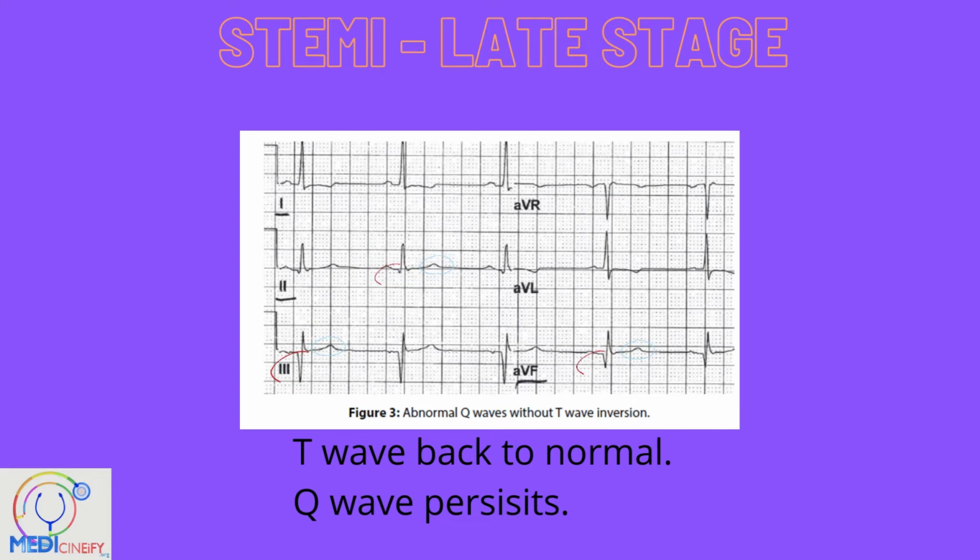Right, the late stage of STEMI, what happens is T-wave back to normal, but the Q wave persists. So here in this diagram, in the inferior leads of 2, 3, AVF, the T wave is back to normal, but the Q wave persists.